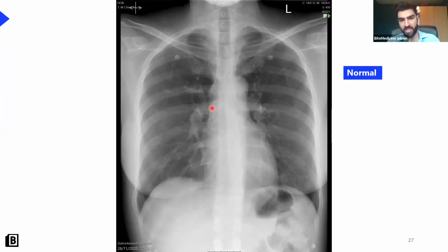Okay, so this is the way you assess the heart. You trace around it and you should be able to see the borders very nicely. Again, the borders of the diaphragm, nice and crisp. Looking around the X-ray, that's all perfectly fine. And again, don't be put off by these prominent blood vessels in the hilar. They are normal. Okay, that's absolutely normal. And yes, it is a female patient because you can see breast tissue. So again, sometimes people think that's a pneumothorax, that's just breast tissue.